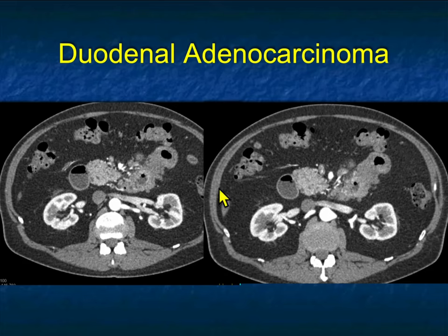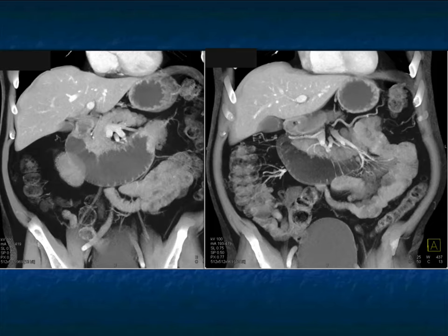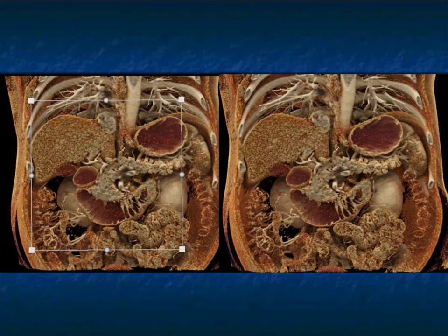There are multiple nodes present around the bowel, which you see small nodes with Crohn's, but you don't see Crohn's that often alone in the duodenum and in the jejunum. And here you can see very nicely the dilated duodenum, then the transition with the infiltration of the bowel. A very nice example of a malignancy, most likely, again shown on cinematic, most likely it's going to be adenocarcinoma.